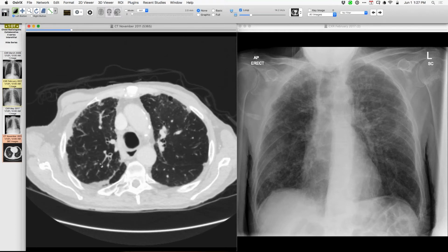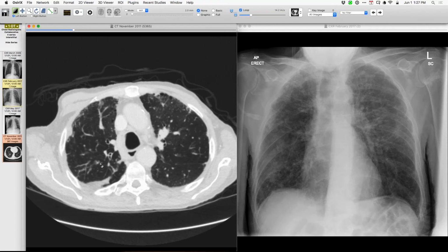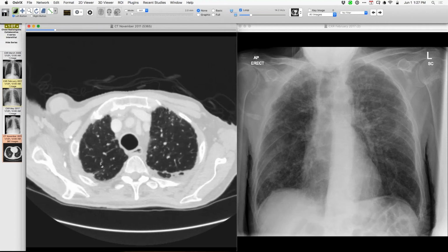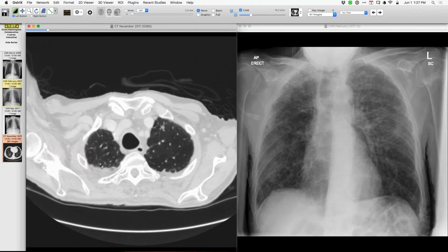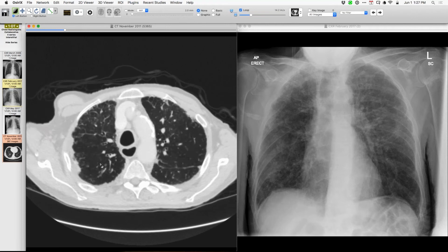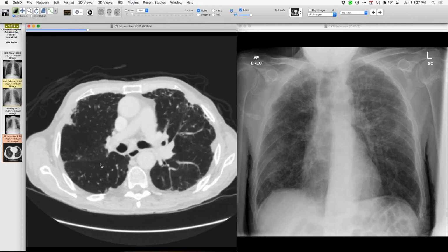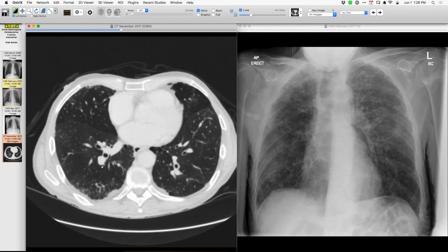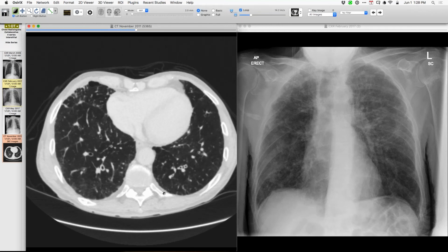So obviously not in the context of lung transplantation or stem cell, but just a person that developed this sporadically. And certainly I think the imaging findings are very consistent with that form of fibrosis. Howard, you also wonder if this patient was an aspirator given the airway-centered stuff and the quasi-abnormal esophagus.